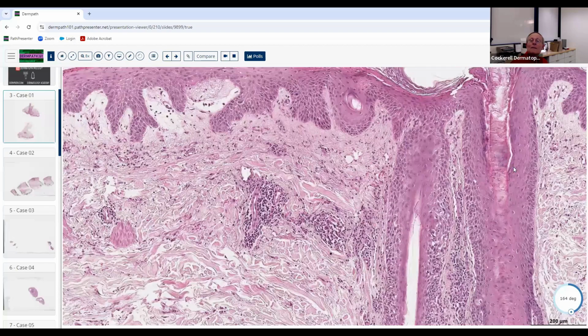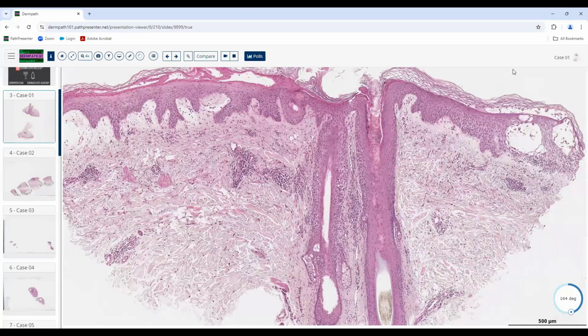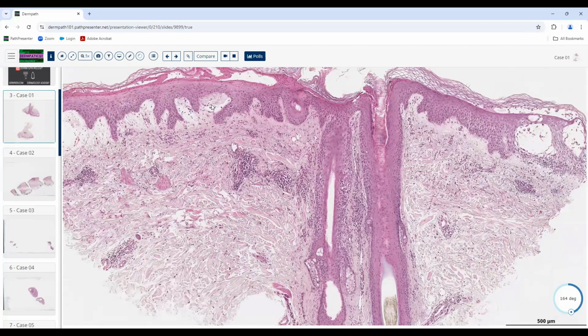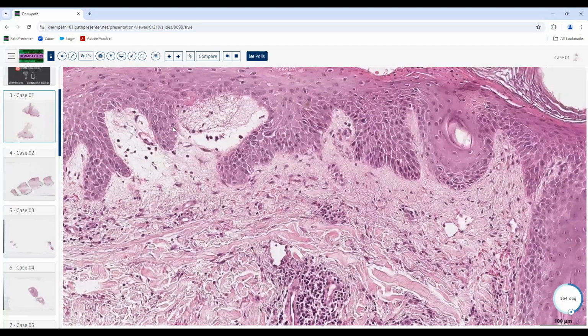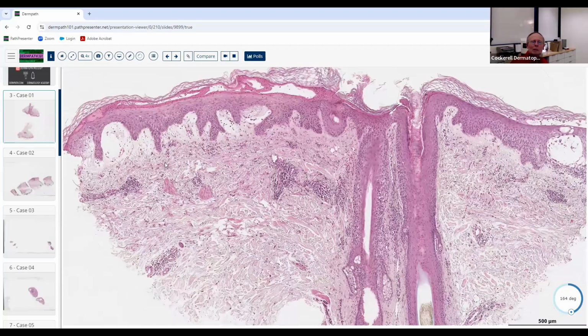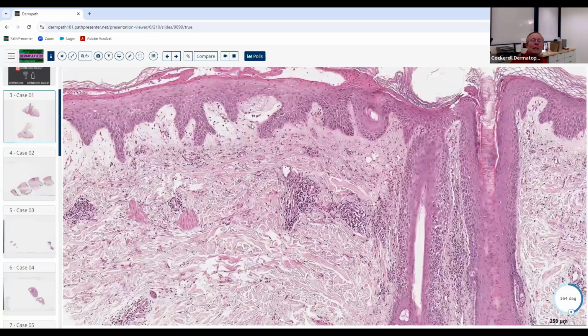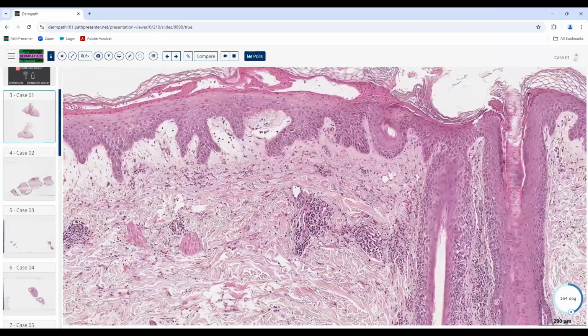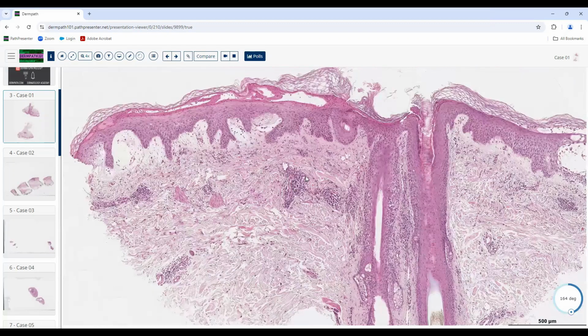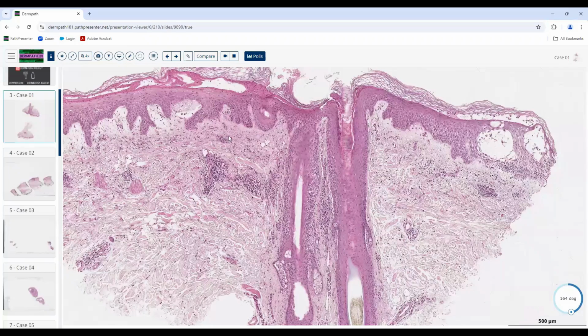Good. Eos, and then we also see some spongiosis in the stratum spinosum, some edema in the papillary dermis area, and also in the reticular dermis. It's hard to appreciate reticular dermis edema, unfortunately. There's so much reticular dermis, it can get pretty swollen and you don't really see it. But you definitely can see papillary dermal edema, and I agree with you that it is here. Absolutely.